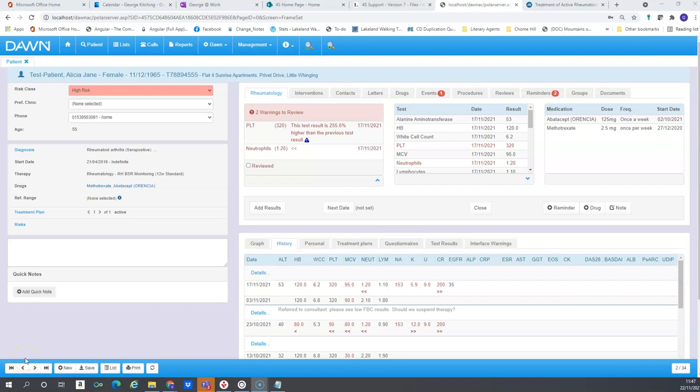In the video on dealing with abnormal results, we did see examples of these in action. We saw a female patient who was on a reference range for female patients where the hemoglobin was flagged at a lower level than it is for male patients. And we also saw an example of another patient who had an even lower hemoglobin lower range limit because her hemoglobin was normally lower than most. What we'll look at now is how you set those up and how you apply them to a patient.